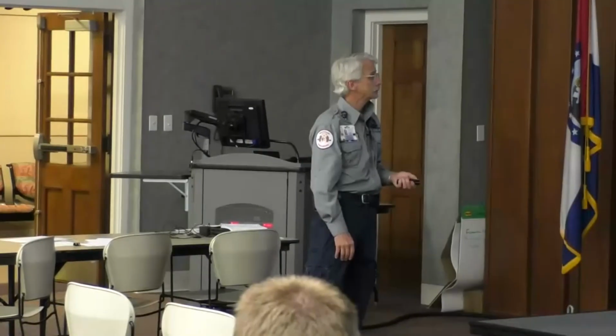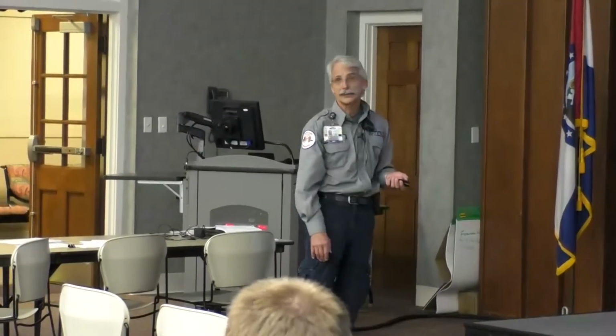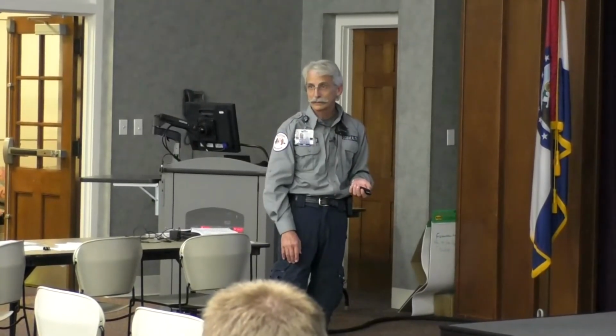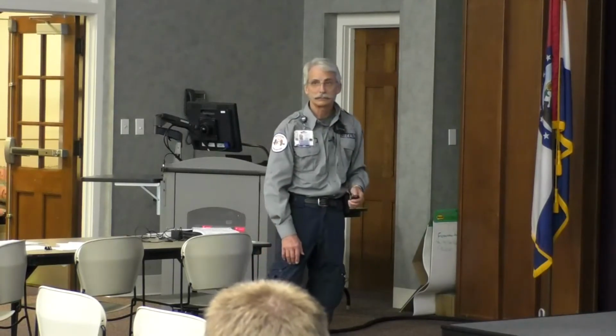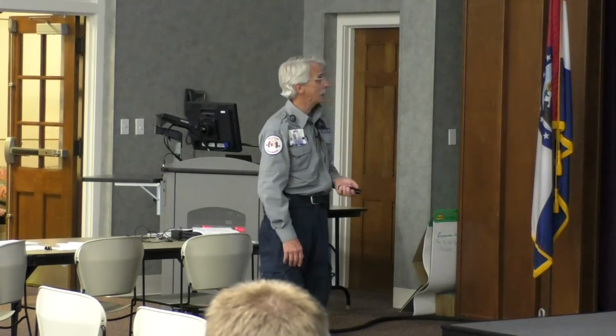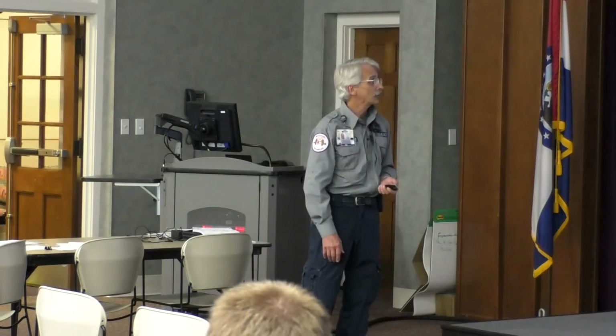All right? And I've seen 12 leads where they did all 12 leads on a piece of paper, and you'd see all 12 of them going across at the same time. All right. So, where's the MI?